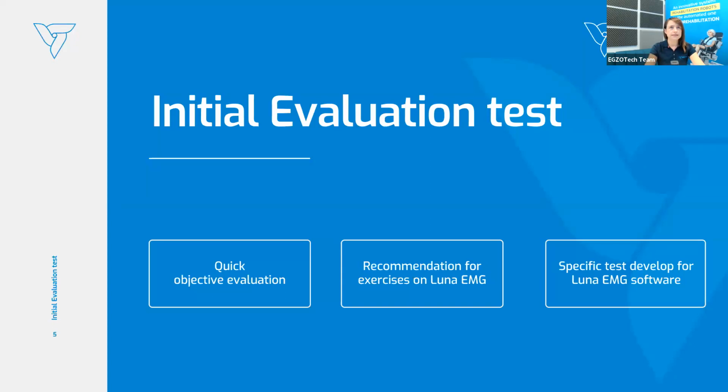So this is something that you can use during your work with the clinic. So this is some information for all the distributors today. And show them how quick the patient can be evaluated, how they can look into the results to see which Luna EMG exercises will be the most suitable for the patient.